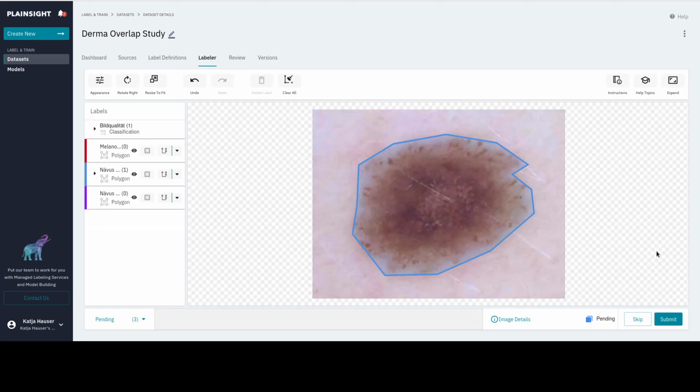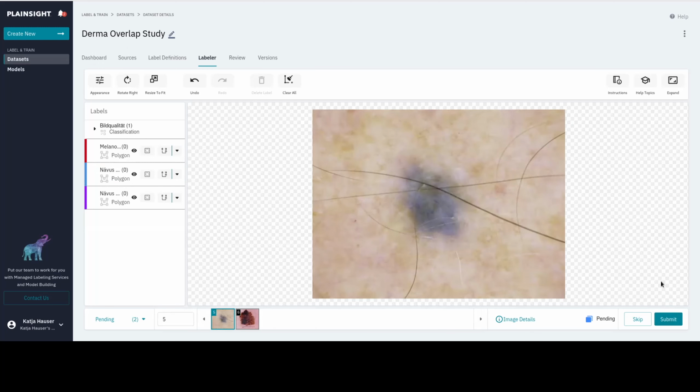If you're now satisfied with your annotations and your explanations, please click submit. Depending on how fast your internet connection is, it may take a moment for the next image to load. I then ask you in this case not to click submit twice, simply because you then send the next image without any annotations. Using this image, I'd like to show you how you can add multiple explanations to one annotation.